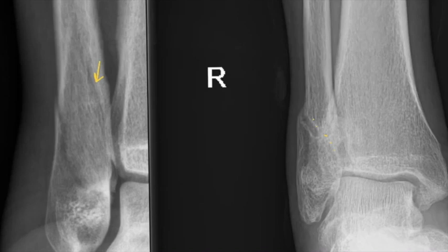Also note that you have a kind of a buildup of periosteal reaction, and the edges are not sharp. Acute fractures will tend to have very sharp appearing edges, but when the edges become blunted and more smooth, then they're healing, and that's indicative of healing or old injuries.